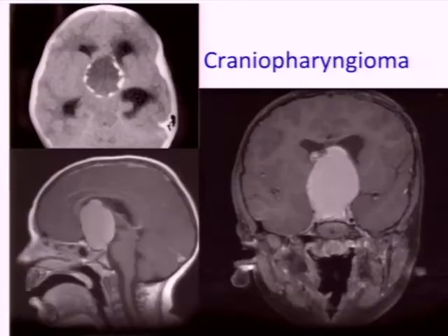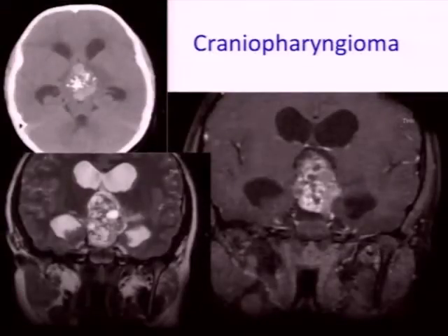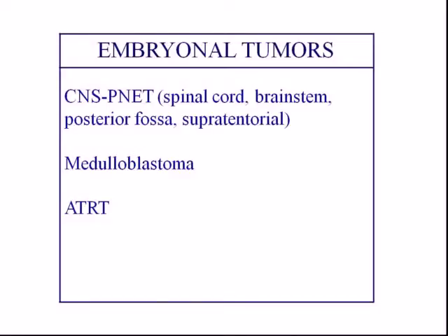Craniopharyngiomas, this is a classic look. Rim calcifications nail the diagnosis. And so if there's any concern and you have a CT, you can usually make that, and you can usually see these on SWI and also on gradient echo imaging. However, craniopharyngiomas can have a solid look also. They tend to be in older patients, and this is just an example of a solid craniopharyngioma.